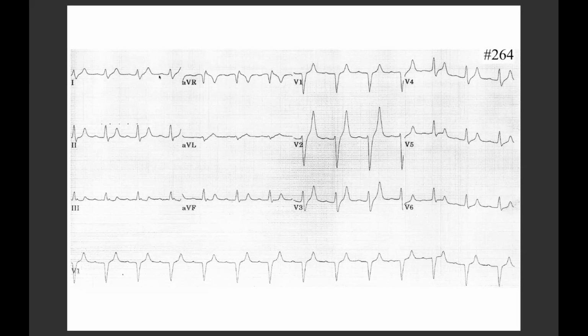So we see every P wave is conducted. But let's see the PR interval, because somehow the PR interval looks... It's a prolonged PR interval. Very good. The PR interval is prolonged. Still, we see every P wave is conducted. So we say first degree AV block.